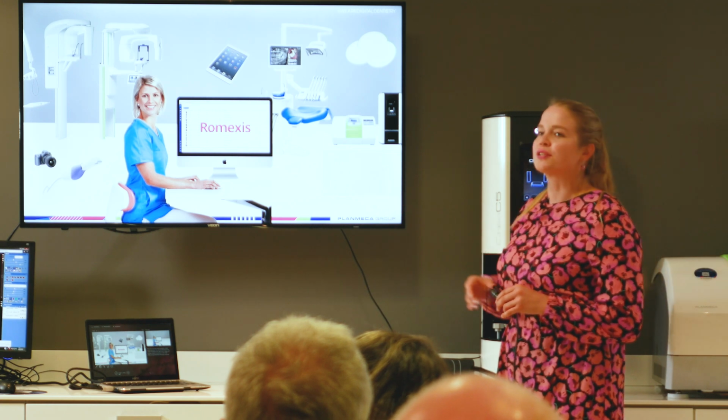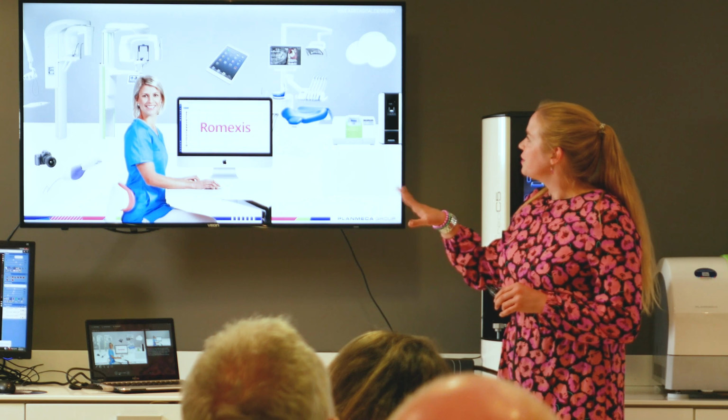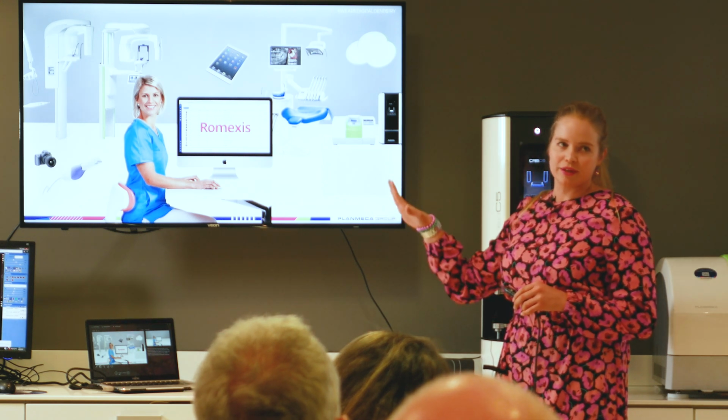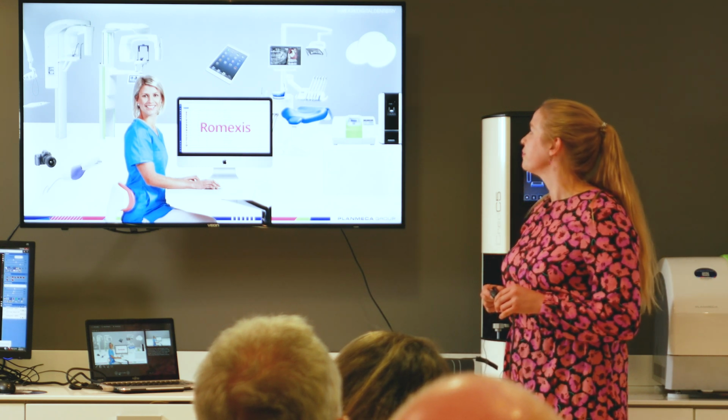our Romexis software. So let's see piece by piece how we can build this kind of imaginary practice and how everything works together with our software platform.